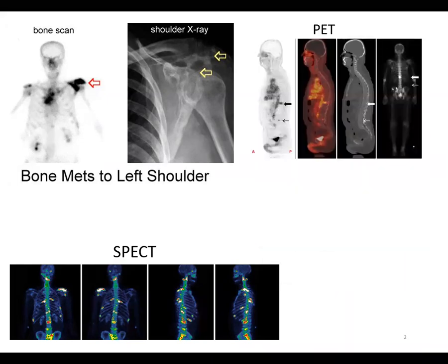On this image, we can also see a more sophisticated contemporary method of imaging of bone tumors, positron emission tomography, or PET. Here we can see the result of this imaging. PET is also a radionuclide method of diagnostics, as well as SPECT and bone scan. These are the three methods of contemporary nuclear imaging: bone scan, SPECT, and PET. Here we can see the result, with details that are not very sharp, but sharper than a bone scan.